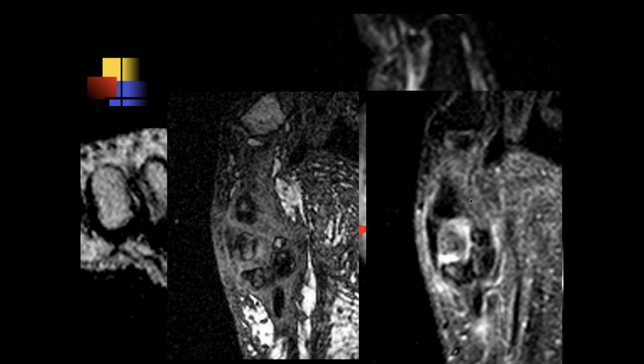Here are the axials. Okay, so here it looks like there are two separate ossific fragments, so it looks like there is a fracture of the sesamoid. Yeah, this patient was a football player. This is one of the forms of turf toe. In this case, it's a sesamoid fracture. You fix these nowadays with tiny screws. Oh, okay.